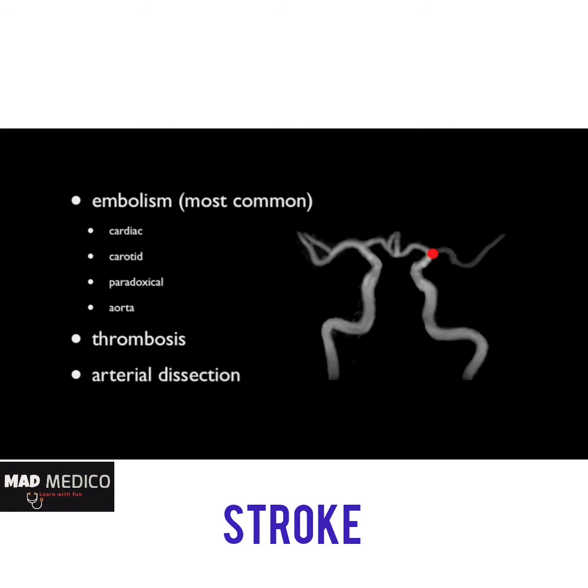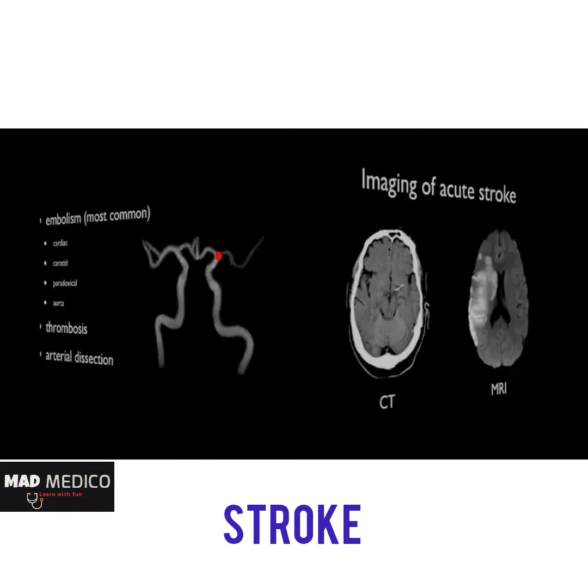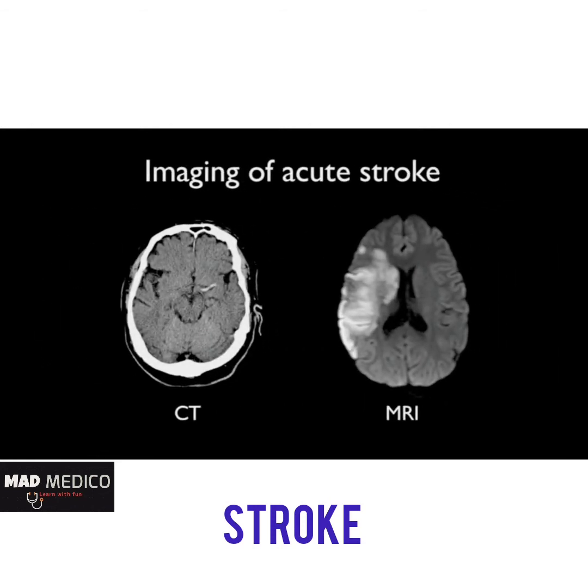of arterial dissection. Imaging of acute stroke is performed either with CT or MRI. The majority of imaging of acute strokes is performed with CT, although MRI is in fact more sensitive. The reason for this is mainly to do with availability of MRI and the ability to get a patient in and out of the CT scanner rapidly without the concern for MRI-compatible resuscitation equipment.